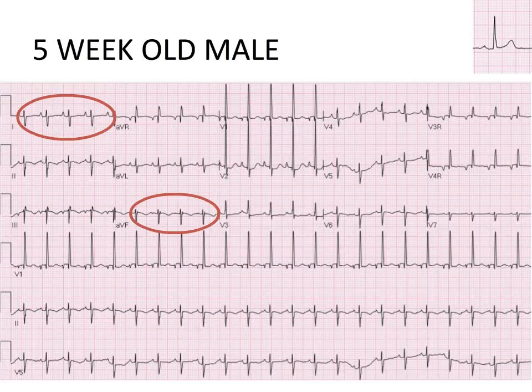You should have found that along with the northwest axis, this EKG has some evidence for right ventricular hypertrophy, or RVH. The RVH can be seen in leads V1 and V2, where there are strong rightward forces, as well as an upright T wave in V1. These findings in any infant over 1 week of age is concerning for RVH. The northwest axis itself is concerning for an AV canal defect. AV canal defects are often associated with RVH and right bundle branch blocks. This patient should be seen by cardiology for an echo and to evaluate for an AV canal defect.